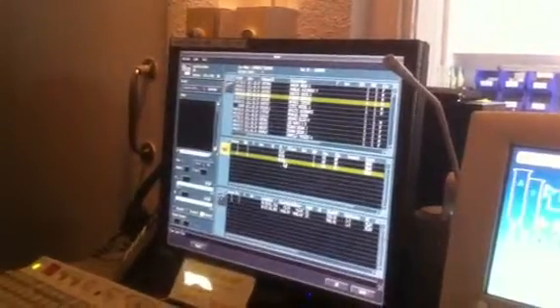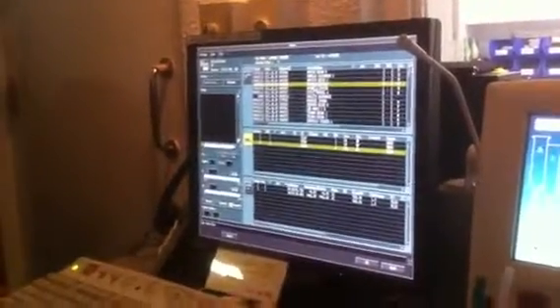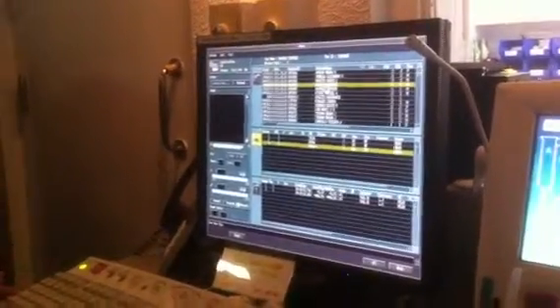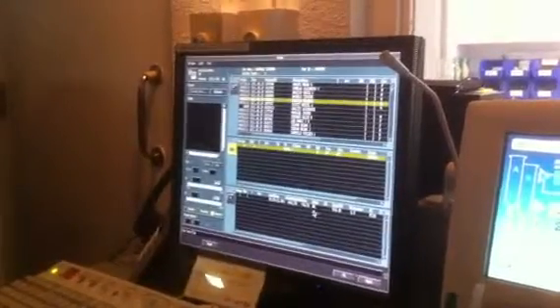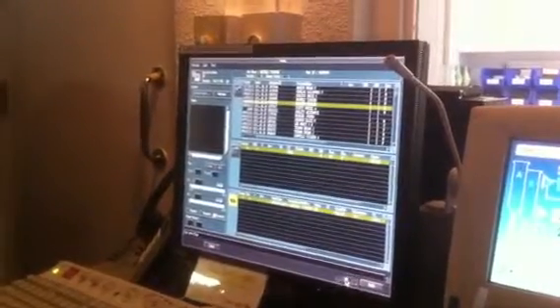Curious. Anyway. Yeah, let's just forget that for now. Okay, so here it is. I'm going to hit OK.